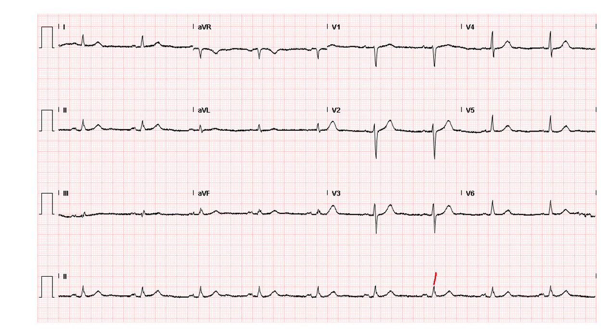The closest one that I can find is this one right here. I'm going to start there, and then use that rote memorization, rule of 300 memorization. So 300, 150, 100, 75, 60. This QRS complex is somewhere between 60 and 50. So I'm going to say it's about 55 or so beats per minute. So it's a little bit bradycardic, but it's a regular rhythm. And therefore I can do that rote memorization rule of 300.